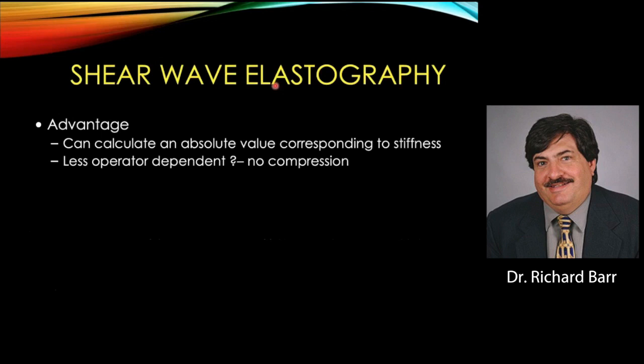The advantage to shear wave elastography, we calculate the absolute value corresponding to the stiffness. We'll talk about the problems with it as we go along through the talk. People say it's less operator dependent, but for the Mindray system, you can just push the buttons between strain and shear wave and not do anything to the transducer and get good results. So the learning curve is exactly the same.